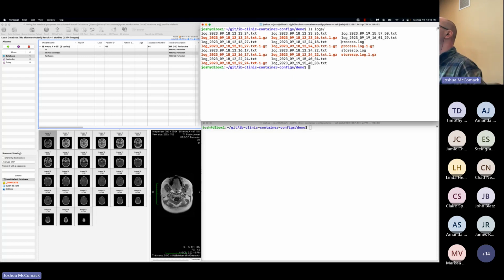And then the other important log is, of course, the process log. This is where we output all of our processing messages for successful or perhaps failed scenarios, where potentially all the input did not arrive, for instance.